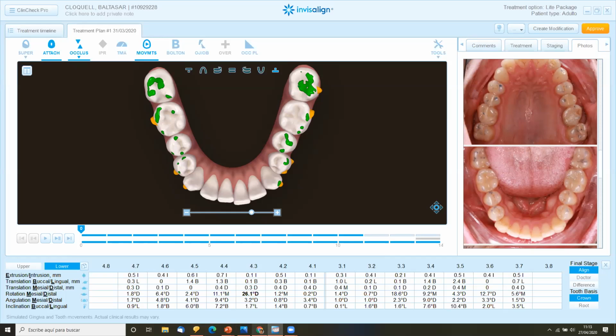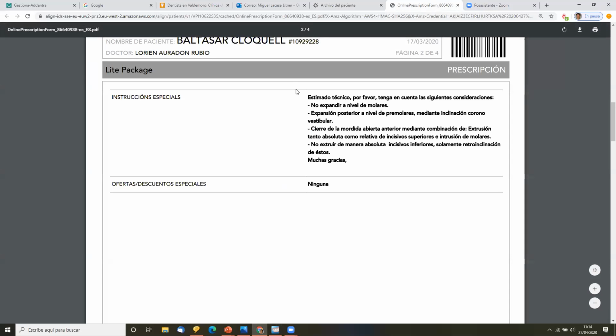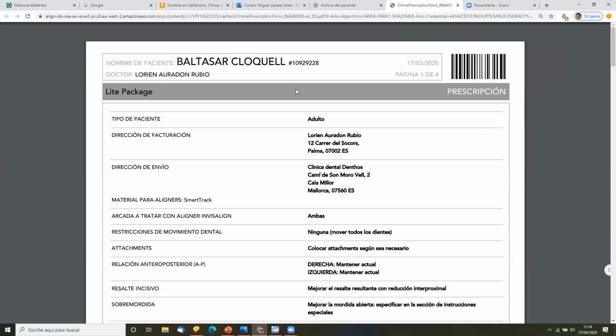Okay, let's see where we have these. Give me 1 second. Okay, here. So what did the doctor tell the system, not just the technician, the system?